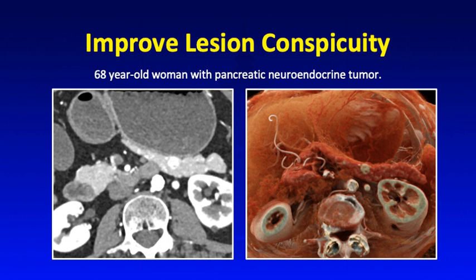And this technique not only works well for hypovascular pancreatic masses, it also works well for hypervascular pancreatic masses, such as this pancreatic neuroendocrine tumor. You can see on the axial image that there is this bright hypervascular mass in the pancreatic body-tail junction. But if you scroll through it quickly, you may mistake it for a vascular aneurysm or just miss it altogether.